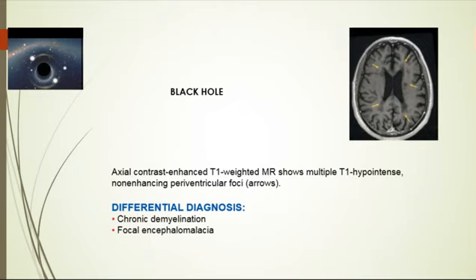Can I put it as subependymal? First of all, it is not subependymal, it's periventricular. Second, it does not follow the features of the gray matter on all sequences. When you are interpreting, you don't see one image; for any patient you have a lot of images and sequences, plus the clinical manifestation, of course, and you have to put it all together. Here we are just looking for the name of the sign.